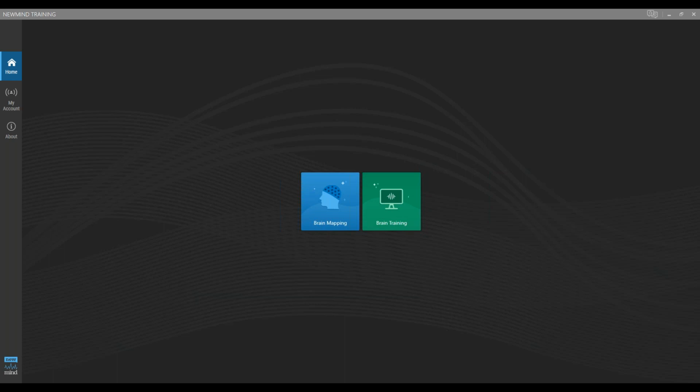Some of these topics today will include recording QEEGs and stopping them, as well as whether you can play back a session. But there are some other questions that have arisen from the Wednesday session on artifacting and all kinds of electrical interference. So we're going to start off with that. So we get everybody unmuted.